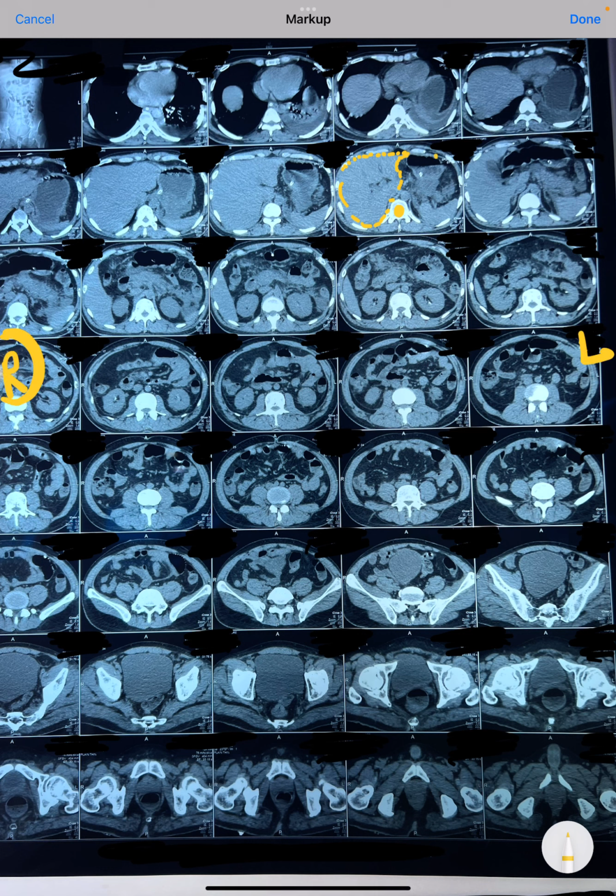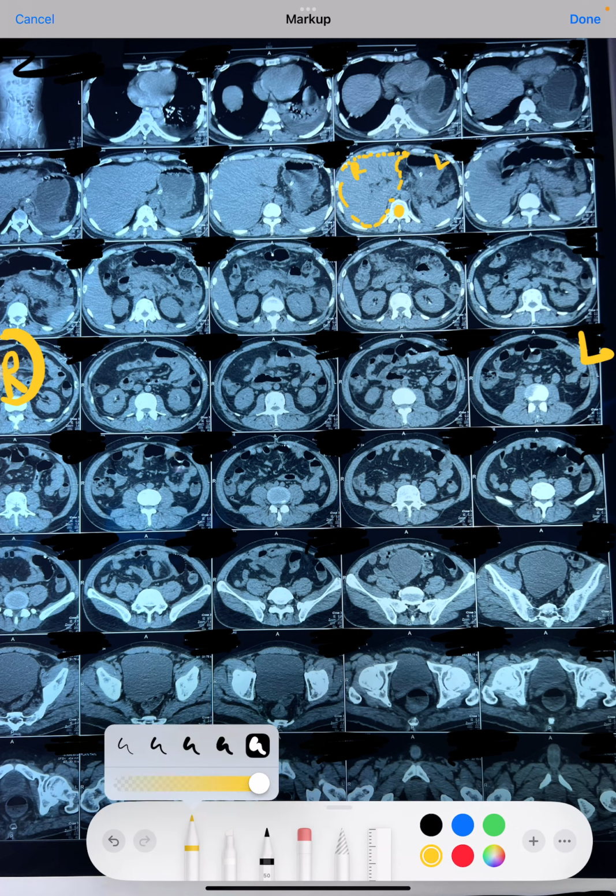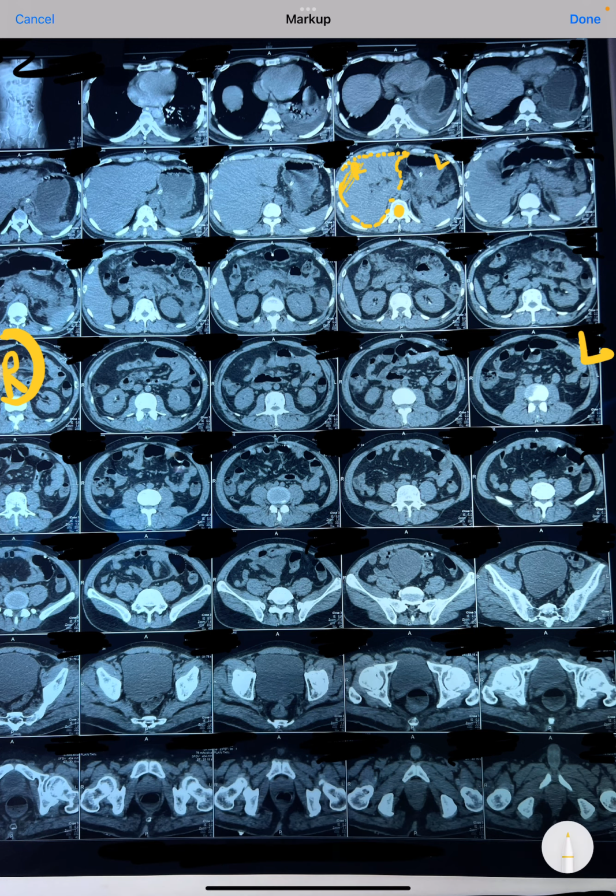So this is left and this is right. So we have liver on the right side. So the largest organ of the body, of 1.5 kg, this is all a liver. So we can see this is all liver. This is liver. This is also liver.